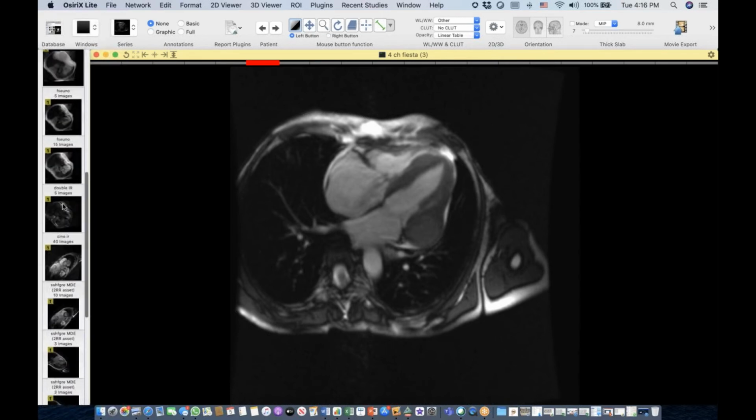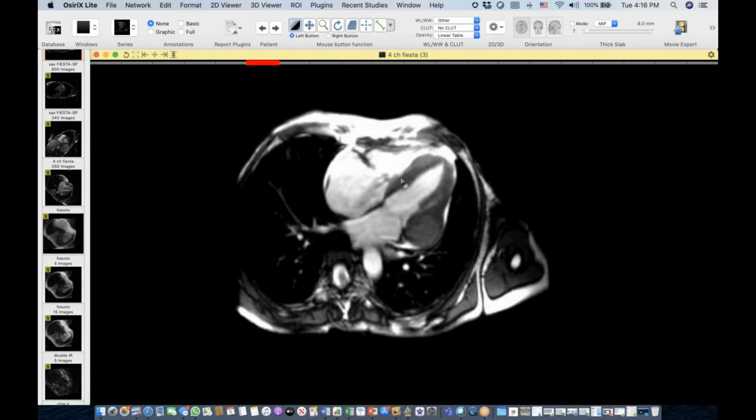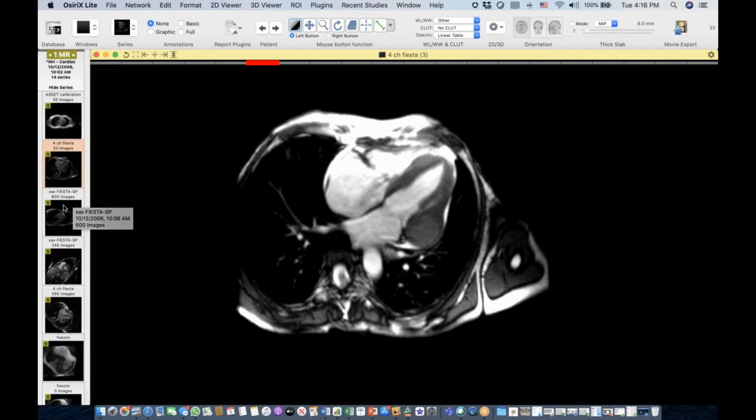Can I ask something? Is there anything in the interventricular septum towards the apex, especially on the RV side? Yeah, that may very well be. It has that also slightly different signal intensity. That's a very good pickup, when I narrow the window a little bit more. Wow, good eyes. And the RV is not dilated despite the tricuspid regurgitation, right? It looks fine in this view, yeah.